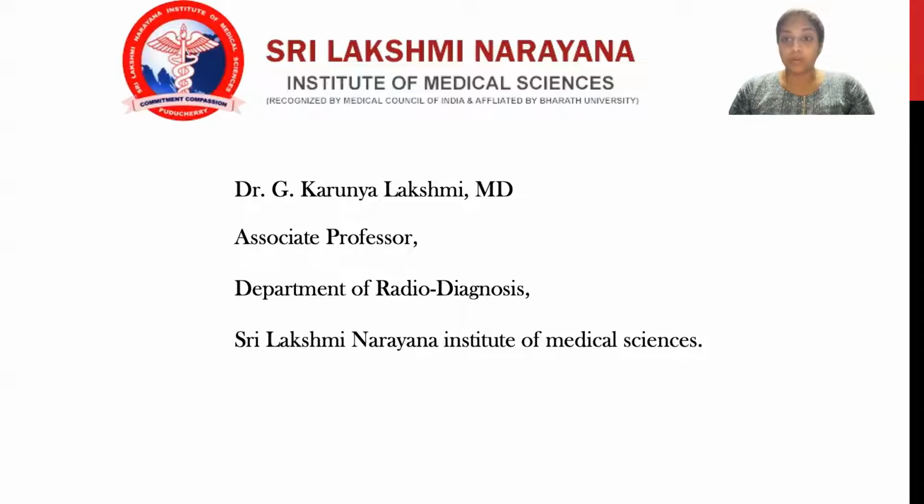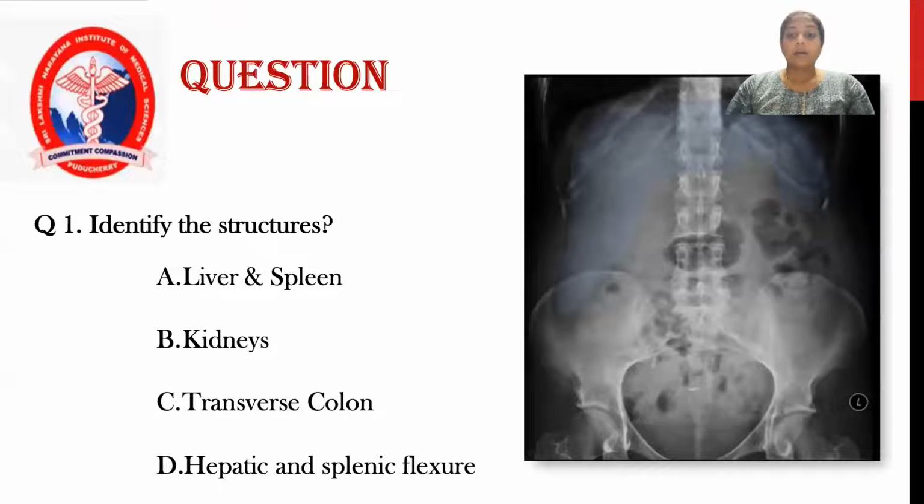Today, we want to talk about a lot of basic radiology. Okay, it'll be like a question and answer session. I want you all to identify what is this blue structure that we see in this image.